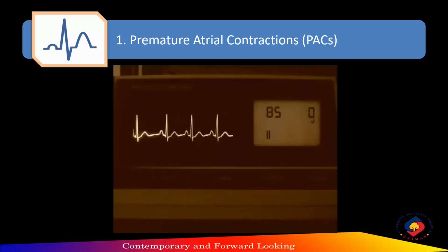On a moving strip, you will not need to count the number of PACs as we will not know how many PACs will be occurring further down the strip. You will only state the number of PACs when you are presented with a static or printed ECG strip.